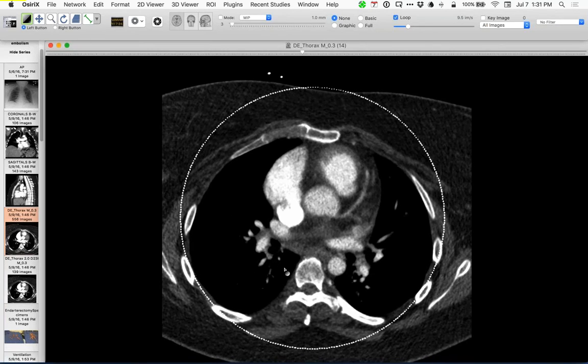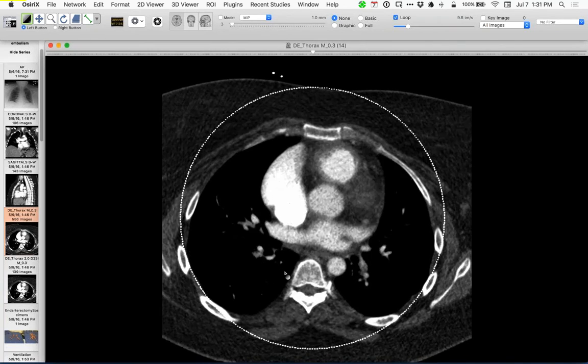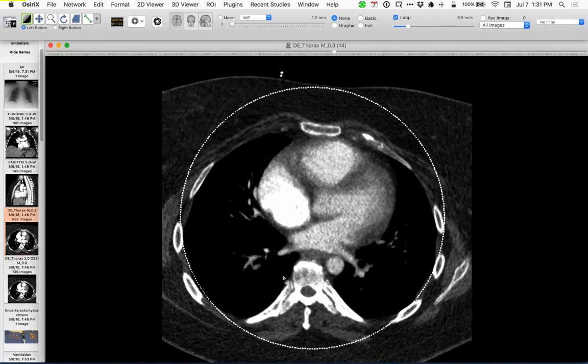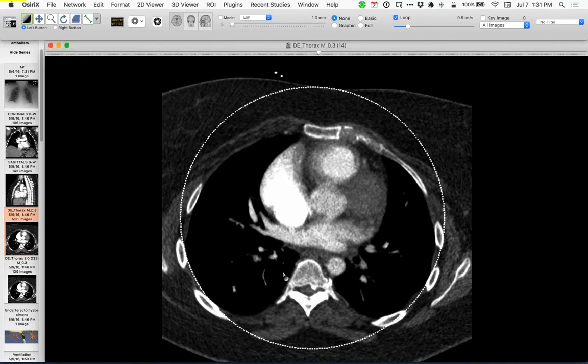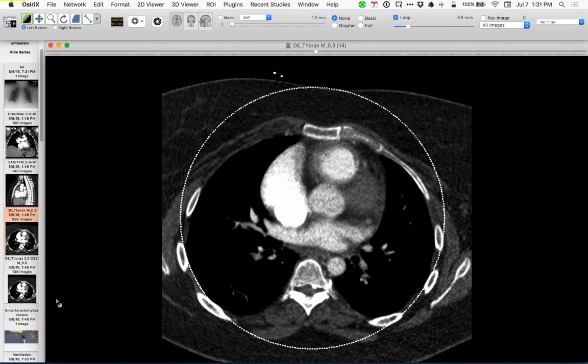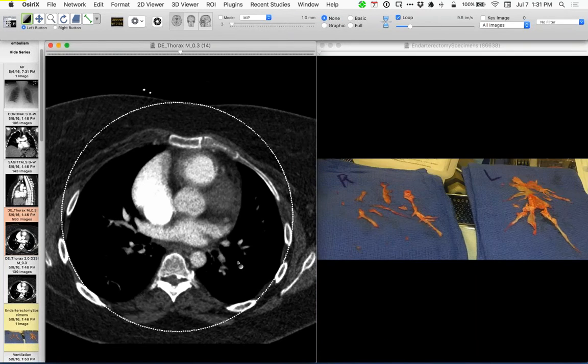So it's really lower lobe, but mostly the proximal segmental arteries of the lower lobes that are substantially abnormal. Certainly this is consistent with CTEPH, but the abnormality is in these lower lung vessels in particular. Now I'll show you what came out of those vessels. This is the material that came out, quite a lot. And these came out of these lower lobe vessels in particular, more on the left than the right.